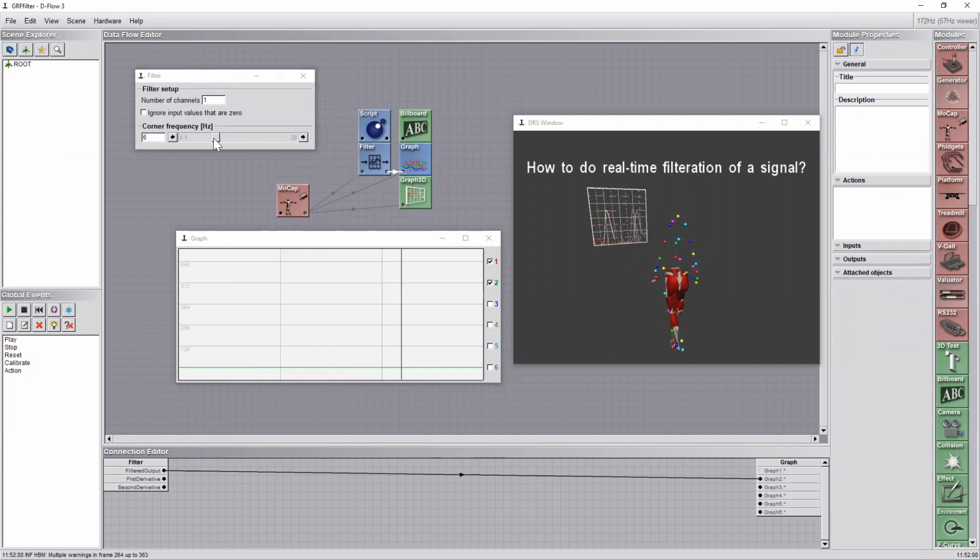And the cool thing is you can change the frequency as you wish here. You can see here, we can actually change, let's say 20, it's pretty much a similar signal you should see. Let's wait for the signal coming back. And then if you change it, let's say a little below 10, you see smoother signals in the ground reaction force. Depending on what you want to do, you can manipulate it.